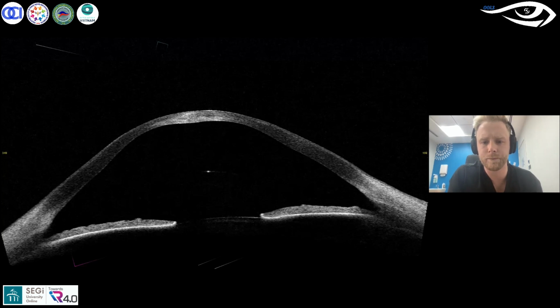Good. So what we've got on the screen here is basically a keratoconic cornea. And we know that keratoconic vision can be variable, in the simplest sense, from very mild cases to very weird and wonderful prescriptions. And this can be quite daunting for a lot of practitioners.